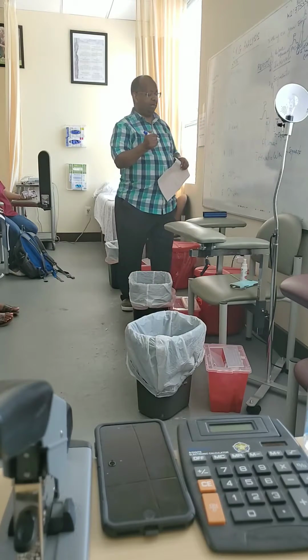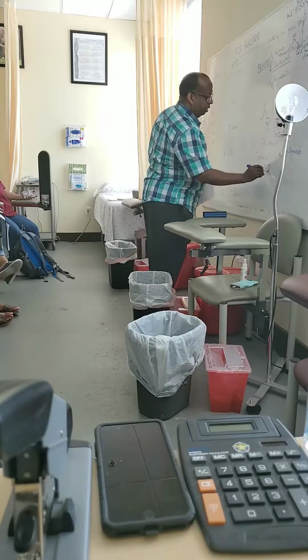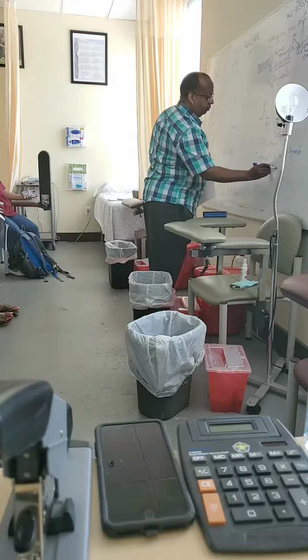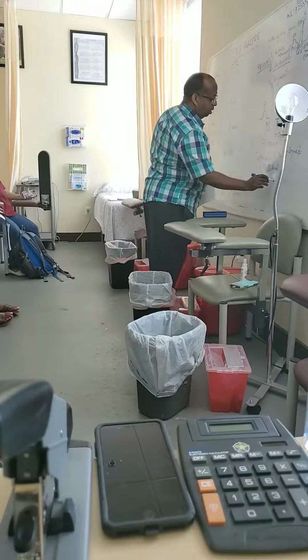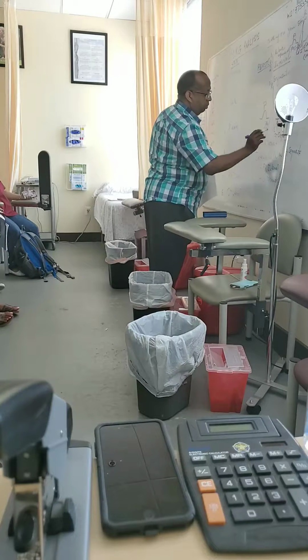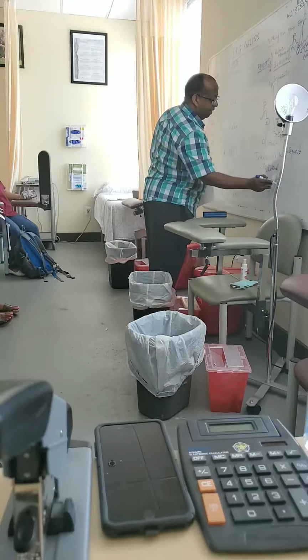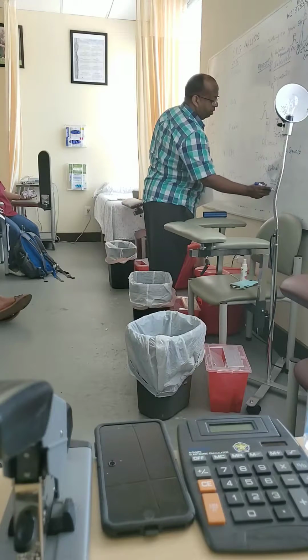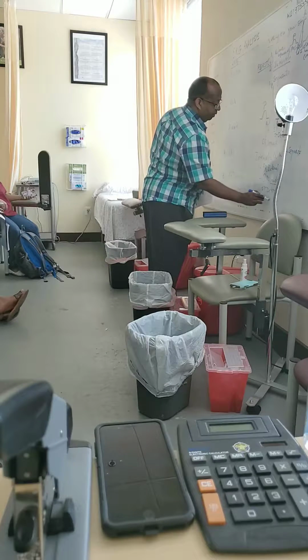So how many intervals do we actually have? We have the PR interval, the QRS complex, the ST interval, which is a little bit different in naming, and the QT interval.